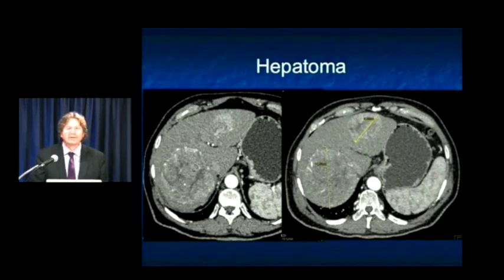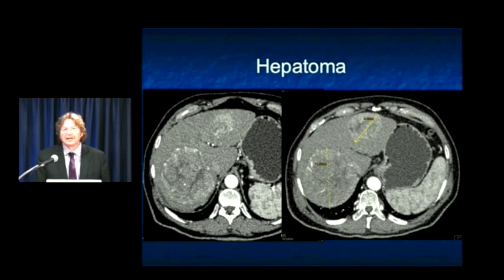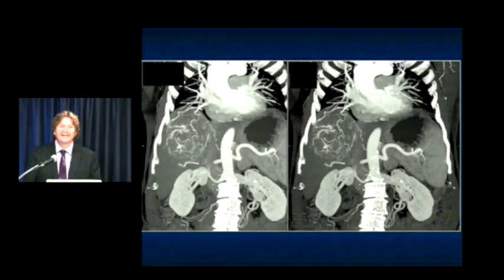We could look at tumors like this where you see some vascularity in a multifocal hepatoma, but again, look at that neovascularity. It's very, very hard to get that same information by just looking at the axial CT. I'll go back to the slide. It's somewhat vascular, but it's not that impressive. It surely isn't as impressive as this image. So what we're looking at in CT is, as far as I'm concerned, almost every study we do is a CT angiogram, because every study has IV contrast, or almost every study, and we inject quickly, we have thin sections, we can create beautiful maps.